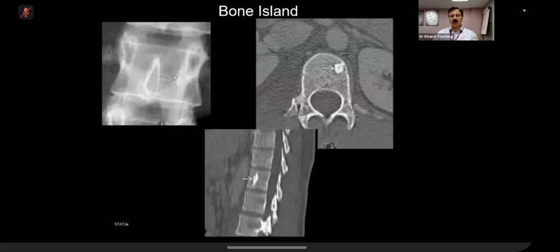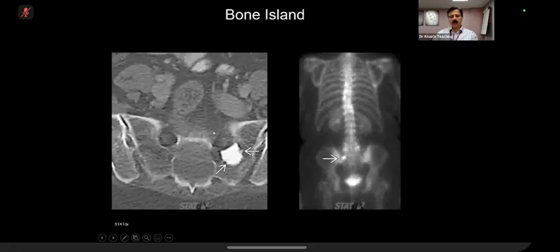So bone island has come in the exam, and this thing is what helps you. Bone islands in your day-to-day radiology are also seen incidentally, let's say in a CT scan. At times it's difficult. But again, if you see it carefully here, you can see this brush border edge. And here, you can see this pedicle, and there was some sclerosis here on AP view.